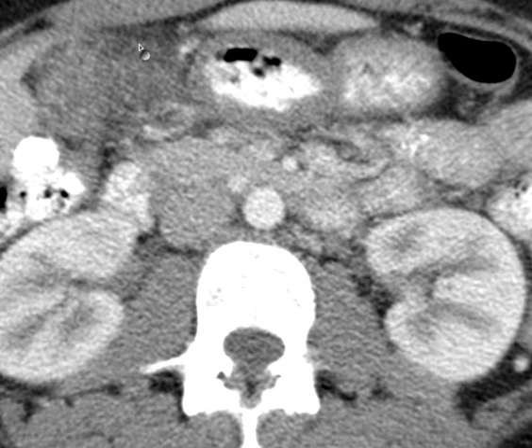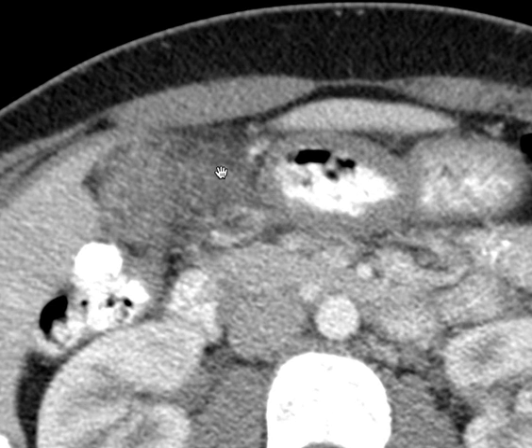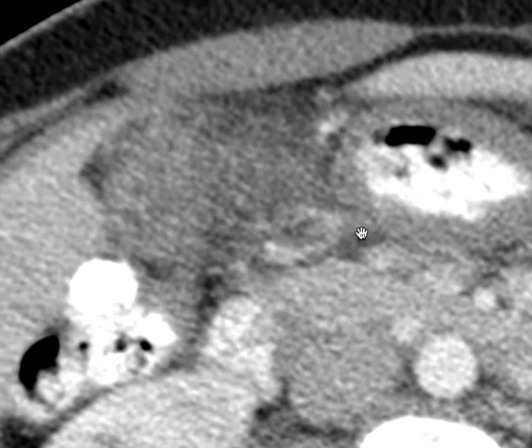So it's a little indistinct here. I think you can see that. Let's see, how do I go around? Okay, so I can move it that way, center it where I want.